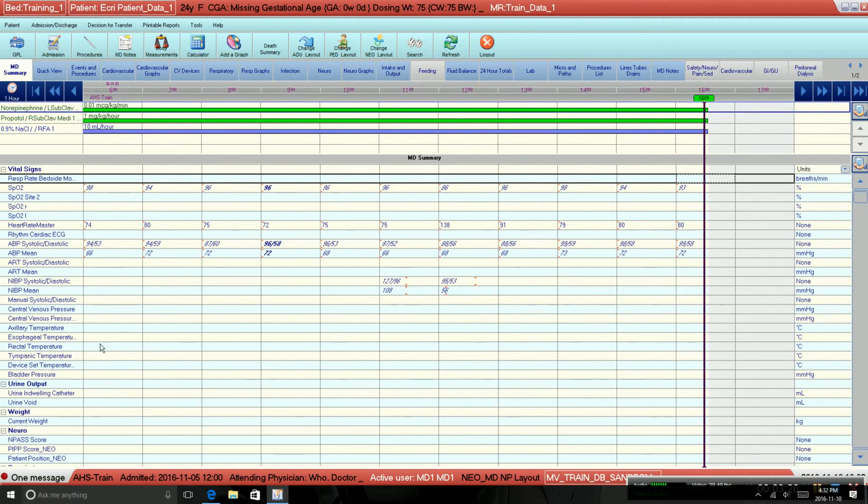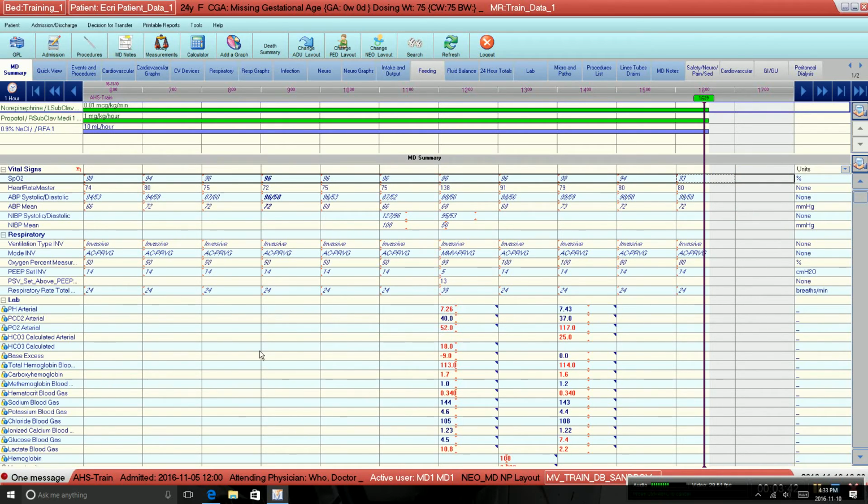This is because in this current view, there are no values there, and so this would just be cluttering up your view. So we automatically hide any parameter that doesn't have any data to show, so that it doesn't make everything messy. When we hide the empty rows, you can see that it tightens everything up again, and as long as there's at least one value in a column in the current view, it will display that particular parameter.